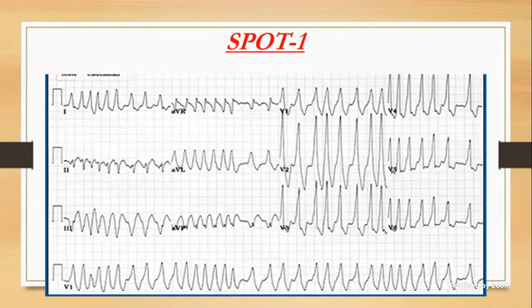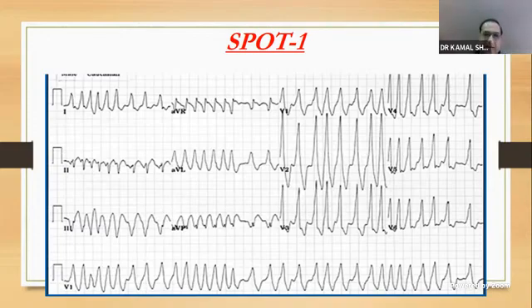Lead 3, AVF. No, sir. No, sir. 1, 2, 3. Minus 60 degree approx. Tail end of AVF. So yes, correct. So you have plus 30, say minus 60. You go to minus 60 degrees.